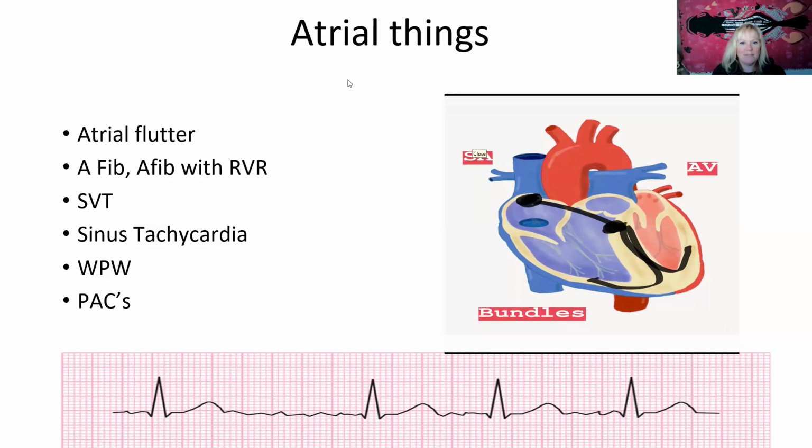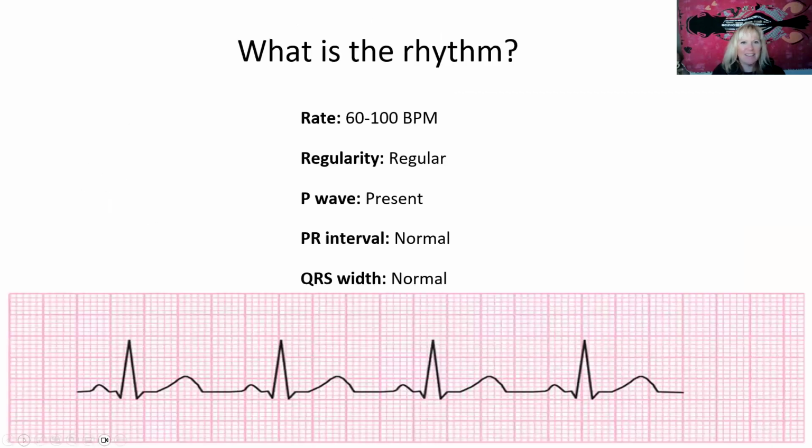Yes, Tanya, this is AFib. We know that because there are no discernible P waves, and that's the clue. It's irregularly irregular. Good. It looks like we have everybody answering on that. Strong work. Now, here's another one for you.